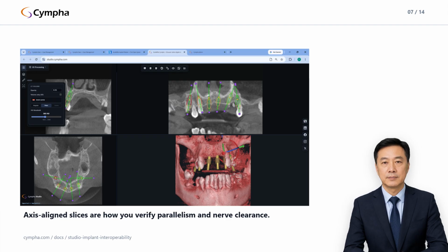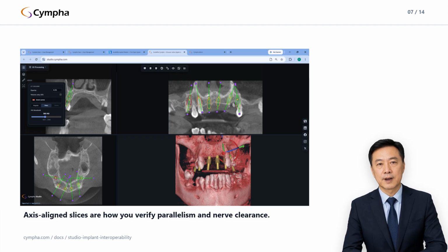While the project is open, the Implant Tools toolbox shows the existing entries, grouped by author, in the order the desktop software wrote them. Read them before you change anything. The previous designer probably explained why placements are where they are, why that fixture is tilted, why that site was avoided, what constraint drove the length choice. Editing first and reading second is how collaborators end up silently undoing each other's careful decisions. Two minutes of reading, then edit with context. And when you're done editing, you'll add your own entry to the same log.